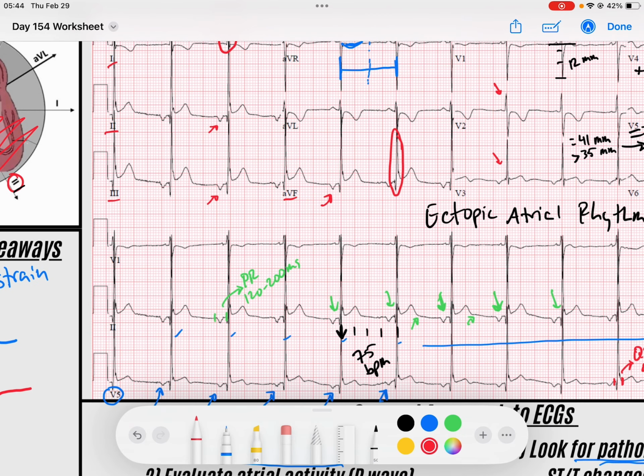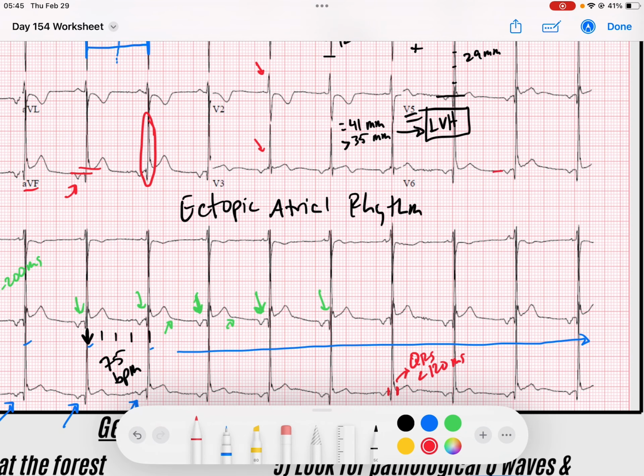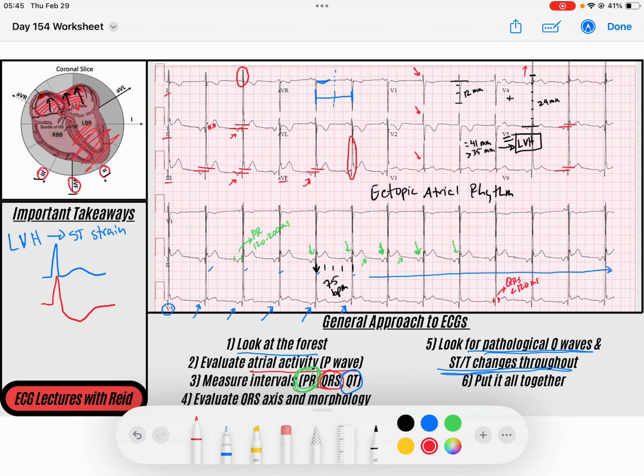I've actually got some ST elevations here, right? If you look, my ST segments are actually elevated in my inferior leads, leads 2, 3, and aVF, we actually have ST elevation. We also have just a little bit of elevation here in V5, V6. So you wonder, is this an inferolateral infarct? Is this an inferolateral STEMI? Well, something else muddies this picture, okay?